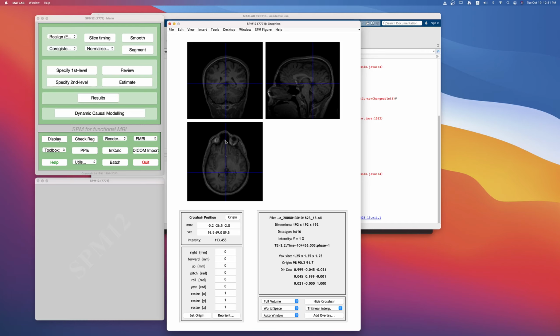And then also you want to see that the brain is not rotated too much to the left or rotated too much to the right, or angled in this way, or too much pitch or too much down. So in other words, that the slice placement that we talked about last class was done pretty well. Otherwise, we will have to adjust. We will have to do some rotations and reorientations. We won't worry about that, but if we need to do any reorientation, we will be using these buttons here, but for now, let's not worry about that, okay?